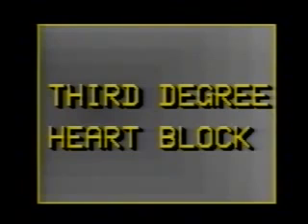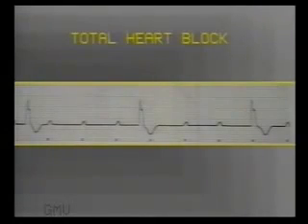Now we come to third degree heart block. Observe this ECG. You can see P waves at regular intervals at a rate of 100 per minute, and there are QRS complexes also at regular intervals at a rate of 30 per minute. But there is no fixed relationship between the two.